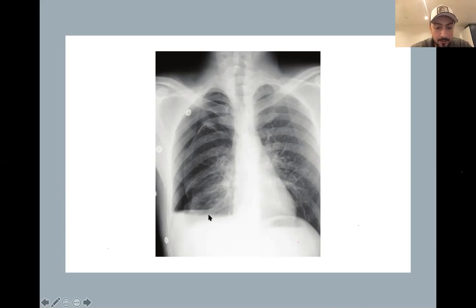actually I forgot to mention something. I don't know if you noticed this thing. It is actually pretty obvious. This is basically the blood filling the thoracic cavity, and the air is basically above it here, as you can see. So we call this hemopneumothorax. Hemo, as you know, blood, pneumo, air, thorax is thoracic cavity, yeah? So this is basically blood and air building up in the thoracic cavity, which can also happen from what's called trauma, for example. It could cause this.